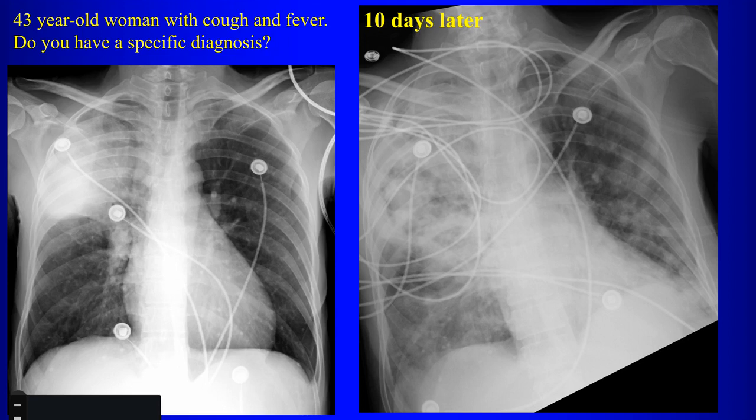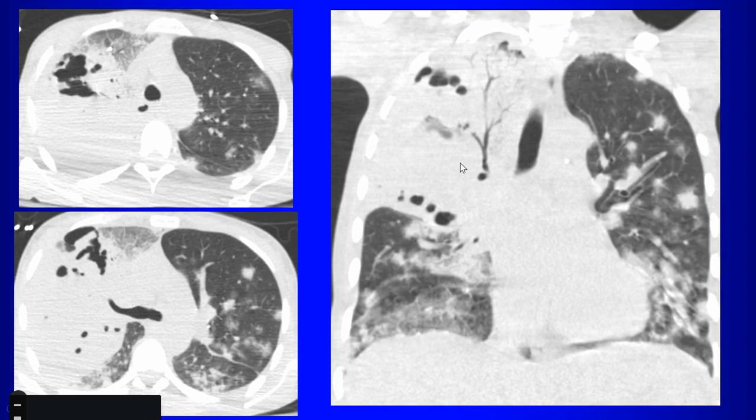We don't see big effusions. If you saw effusions, of course, you would suggest that empyema is a complication. Well, what kind of pneumonia can cause the lobe to get larger and is necrotizing? Staphylococcus. Staph can do that. Klebsiella can do that. There's a particular name we attach to those kinds of pneumonias. What is that called? Notice that the lobe itself is increased in volume. There's cavitation there. The pneumonia is spread bilaterally. Anybody know the name we attach to this? Friedlander's pneumonia, when the lobe actually gets bigger in size.